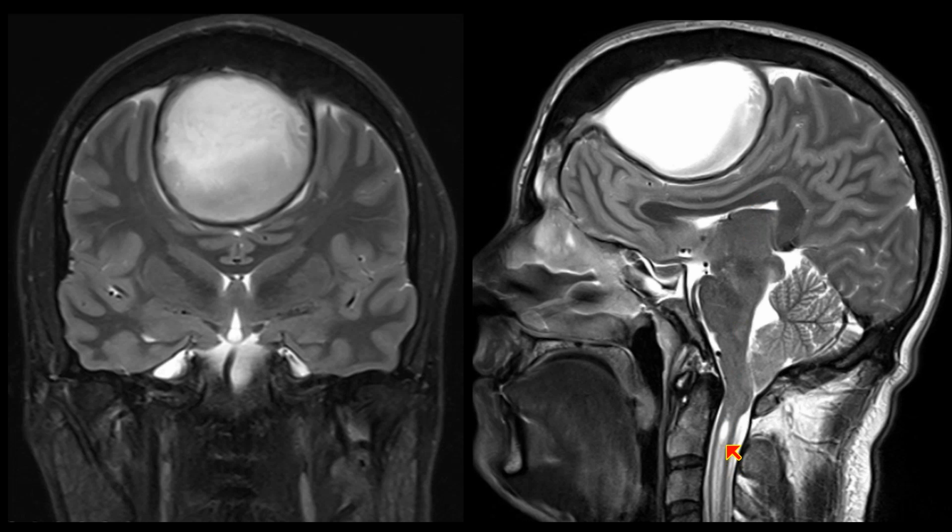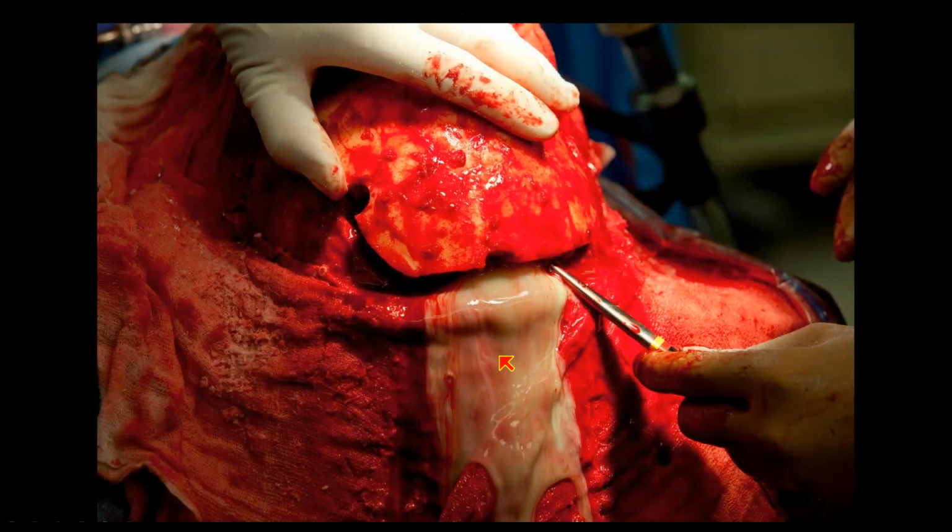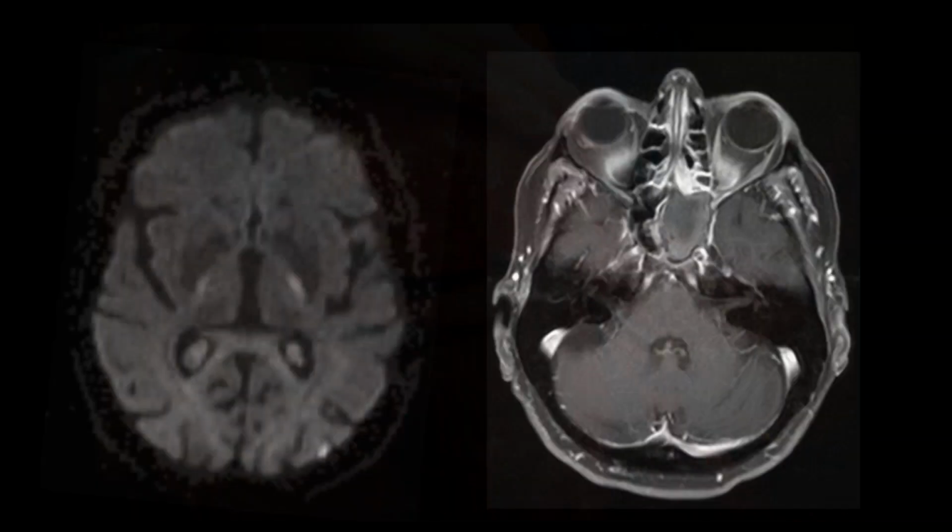So this was a frontal sinus mucocele that decompressed itself intracranially instead of going anteriorly. And that was another case that intraoperatively ended up having a big flow of pus and infected material that flowed down from his bifrontal craniotomy we see here. So we see that sinus disease can be very exciting very quickly.